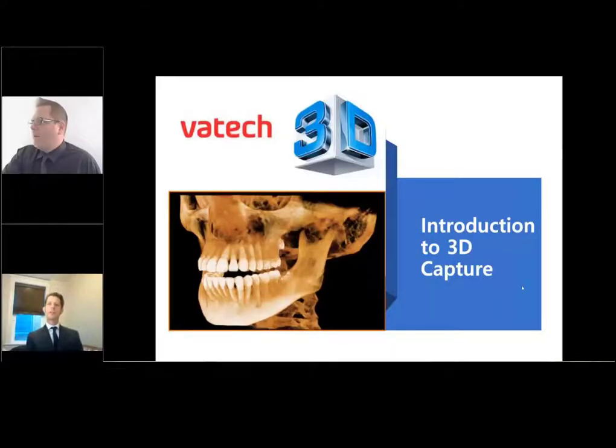All right, so Paul, let's move into our introduction to 3D capture, capturing a CT. And Paul, I know a lot of times we get questions from staff, or really offices, of what am I capturing and why? We'd like to explore that, taking the fear out of capturing. This is a lot easier in our minds, and some feedback from our staffs of capturing CT. So let's delve into that right now.